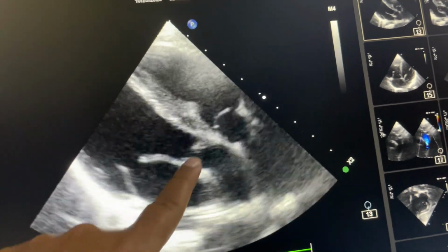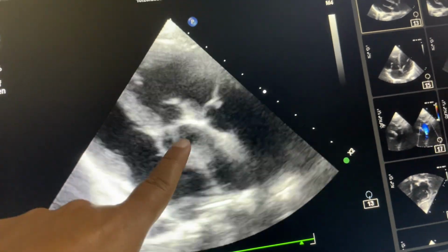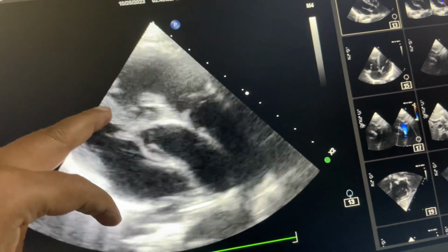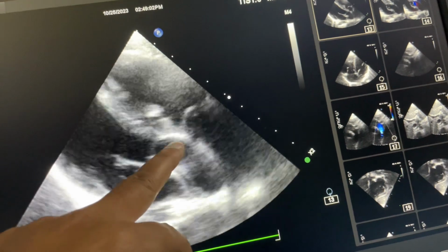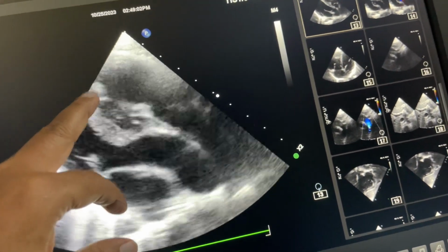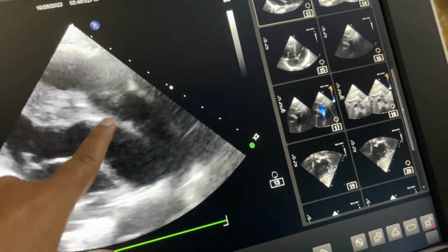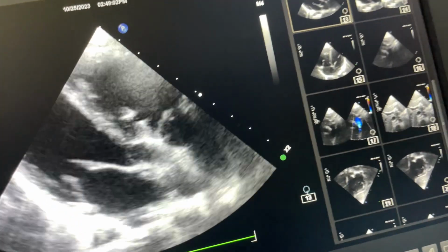Whenever pulmonary artery arises from left ventricle, it goes posteriorly. If it had been aorta, then it would go anteriorly. So a structure that arises from left ventricle is pulmonary artery because it goes posteriorly. At the same time, you see the plane, this is interventricular septum, this is the anterior plane of pulmonary artery. Both are in the same plane. That means this is pulmonary artery.